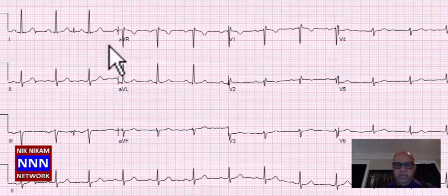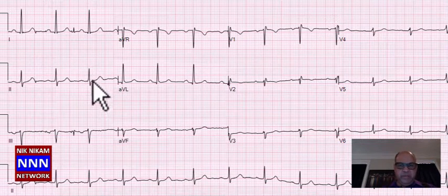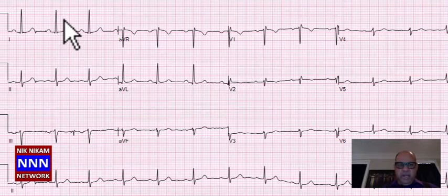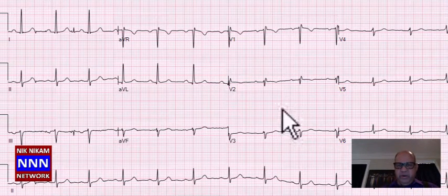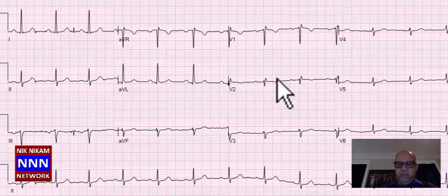Sinus rhythm. We see some artifacts here. You may think, oh, this is a pacemaker beat. No, not really. You must be able to substantiate it in other leads, and it's maybe just an artifact from what I can see. Anyway, high anterior looks okay, and inferior leads look all right. No left axis deviation. We have an RSR prime, which is probably non-diagnostic. If you want, you can put it, but at the same time, there is poor R wave progression in the chest leads. The voltage criteria is very, very low here.